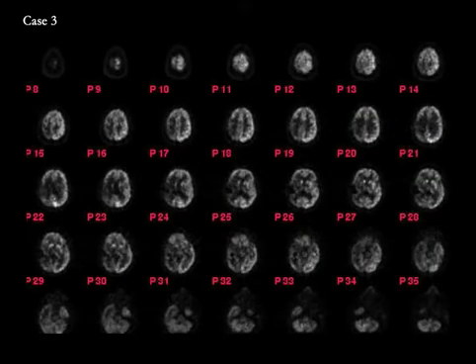The next set of transaxial images are from an FDG PET-CT study of the brain. The finding here is in the right temporal lobe, seen here. There is a photopenic defect from a prior surgical resection cavity. A primary brain tumor was removed from this region, and now we are trying to evaluate if there is any evidence of recurrent disease. Sometimes in this situation, MRI of the brain with and without contrast is limited, and we use FDG PET to see if there is any hypermetabolism in recurrent or residual brain tumor.